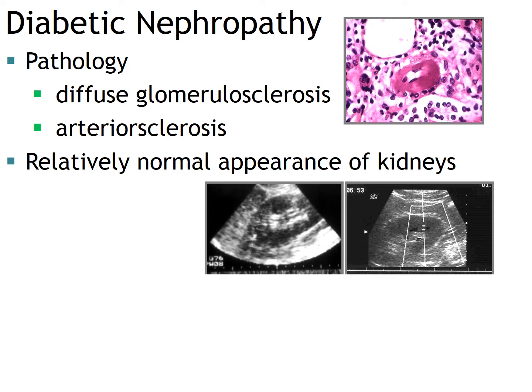One renal parenchymal disease where Doppler ultrasound may play an important role is diabetic nephropathy. The main pathologic findings of diabetic nephropathy are diffuse glomerulosclerosis and arteriolosclerosis that may increase renal vascular resistance as the disease progresses. It is known that kidneys with diabetic nephropathy are enlarged in the early phase of the disease, and so they may appear quite normal even when the disease is quite advanced.